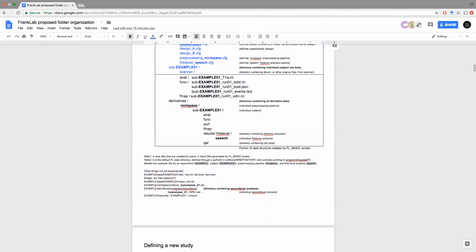I often just use the T1 because I visually like those better, and because they have the skull, which in older versions used to make a difference. In newer versions of SPM, it doesn't so much. So it's mostly for historical reasons. If you want to try with different versions and find that some work better than others, that would be fantastic information to have. But currently, T1 would be the default recommendation, lacking any additional information.